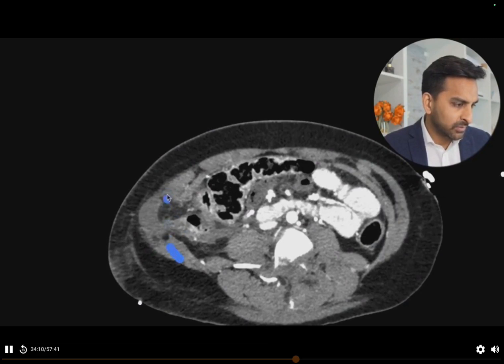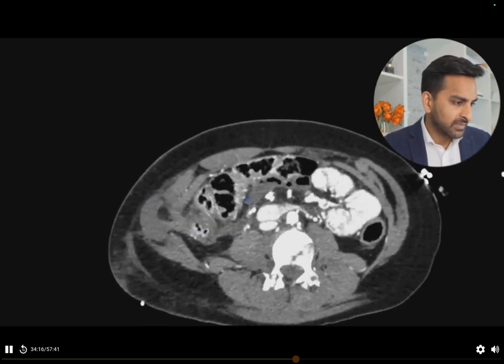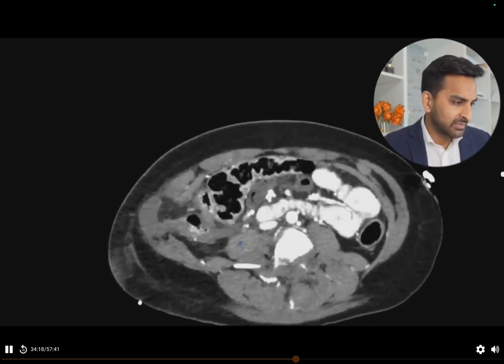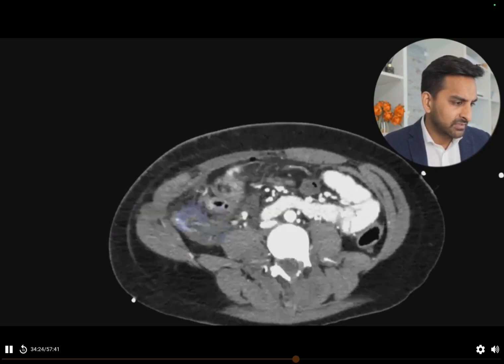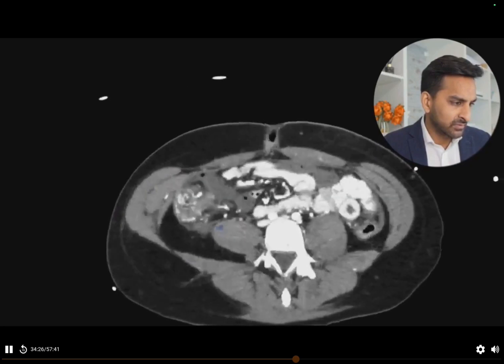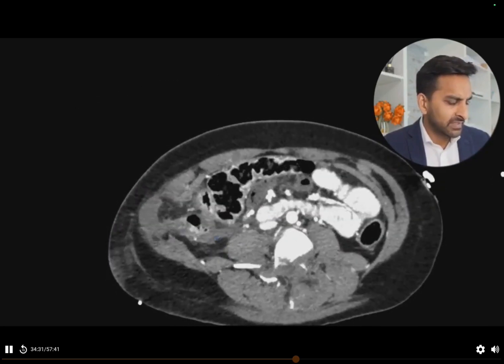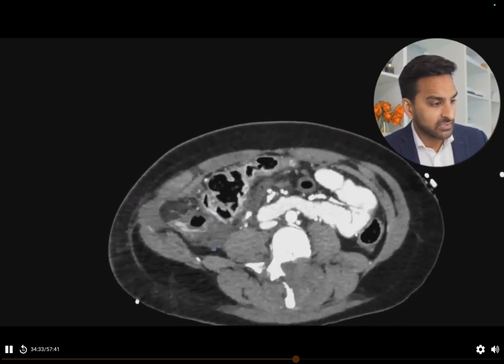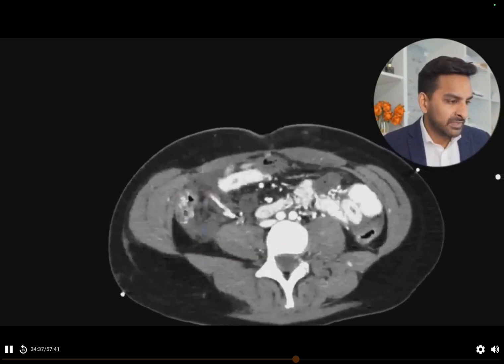So abdominal wall, and there's some sort of extrusion of material located within the area emanating from what looks like could be the cecal pole. And just generally, the cecal pole doesn't look very happy and looks like bowel, and then looks kind of discontinuous located within that sort of lower abdominal area. So it looks like what we have here is a herniation of some of the intra-abdominal fluid through a defect in the right abdomen. So this is not great.